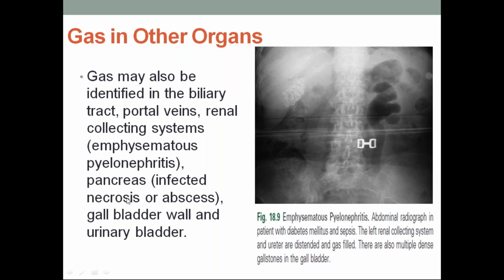And in the pancreas, infected necrosis or abscesses, the gallbladder wall, the gallbladder and the urinary bladder. In these conditions, in these organs also, you'll find gas.